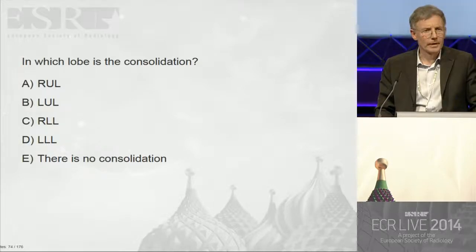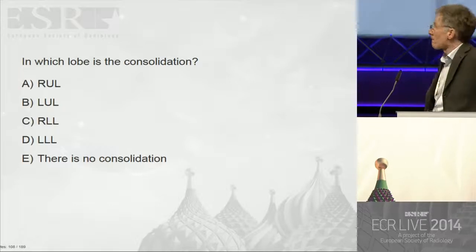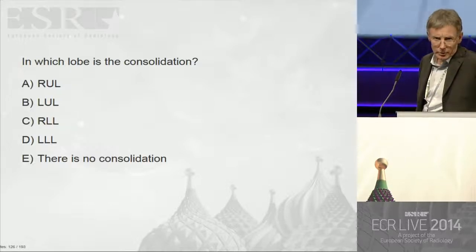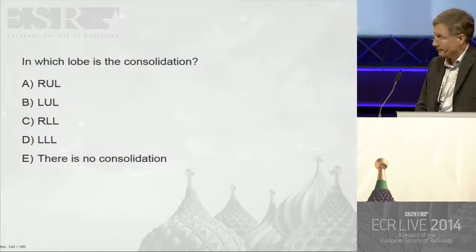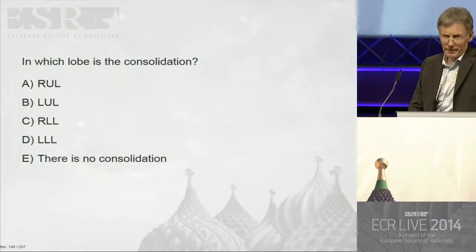And of course, you're perfectly entitled to reply that this X-ray is normal if you think so. So please vote now. We're looking for radiological signs of pneumonia. Thank you. We can have the results, please.